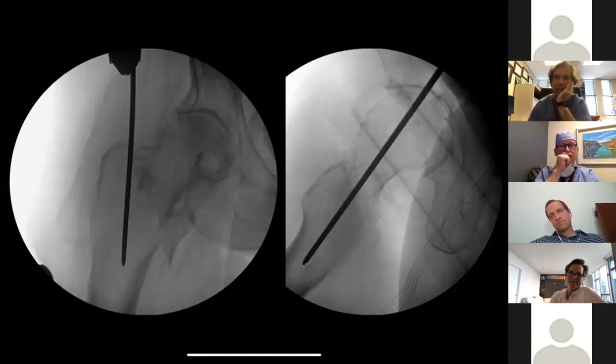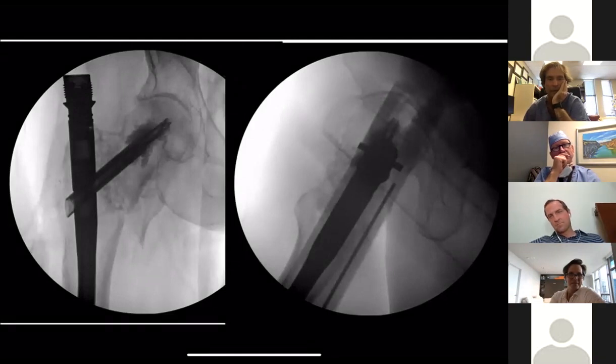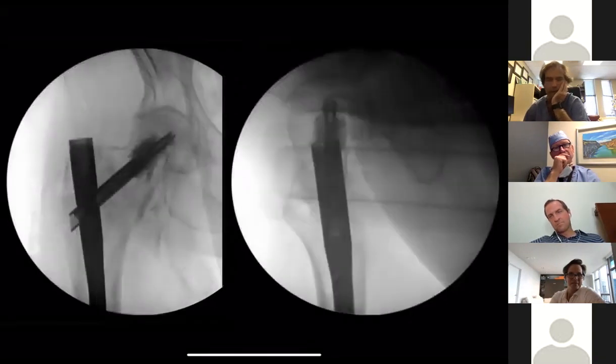All right, so do you like the starting point and entry angle? Yeah. Okay, so I was worried about the instability here, and so we used augmentation. We don't have to talk about that. That's just what you see going on. All right. So what do you think?